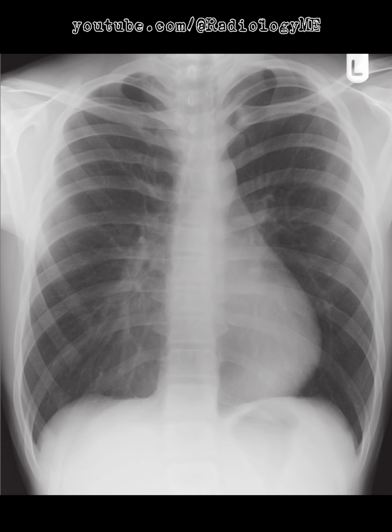The right lower zone opacification may well be related to this rib deformity rather than a true consolidation, especially in the absence of clinical symptoms like fever or productive cough that would hint at infection. So in terms of differentials, while we can't completely exclude possibilities like right middle lobe consolidation, atelectasis, or even pleural thickening, the rib deformity and the displacement of structures really point us towards pectus excavatum as the most likely explanation.